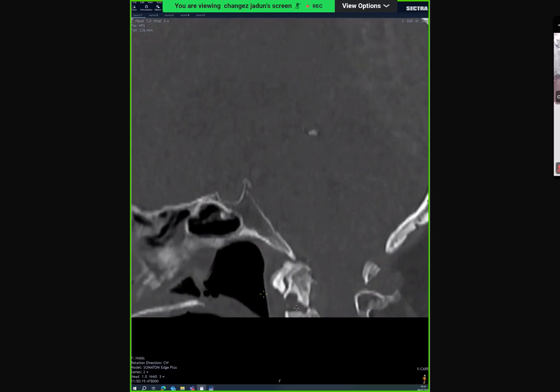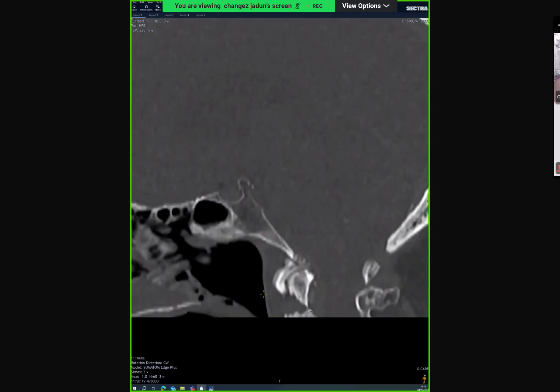This is an old patient, and getting a CT scan is much easier. So you would want to have a CT look of the cervical spine, and then depending on what you see, you would ask for an MRI, because this fracture does not look acute.